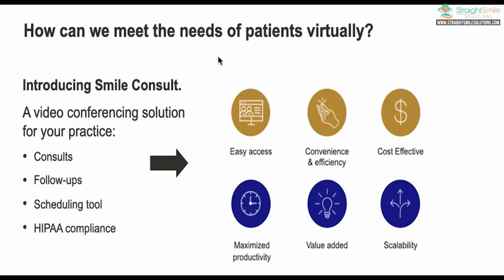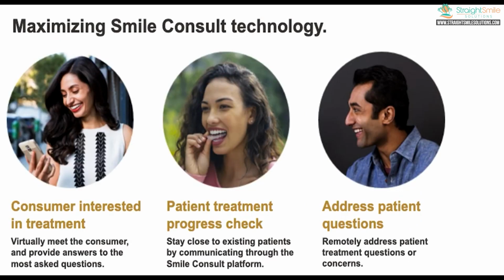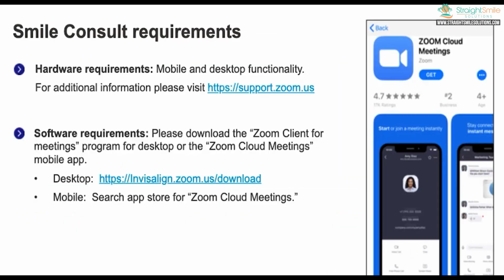that you can get from the My Invisalign app that the patients do. It allows them to log in, to chit chat with you, to consult with you, and they're basically using the Zoom platform. And so it's a great way to, still, if you're shut down or you're closed, you can still do virtual consults. You can still check in on your patients. You can even do progress checks, progress check-ins without the AI and answer patient questions.